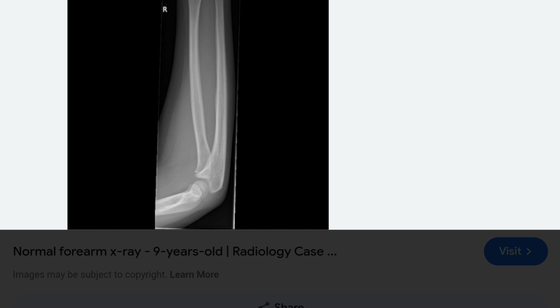Will you order anything else if this is what you see in the emergency department? Definitely, after resuscitation and preliminary examination, I would like to get screening of the spine, lumbar, cervical and thoracic, and radiographs of both feet. How will you proceed if this is the only injury?